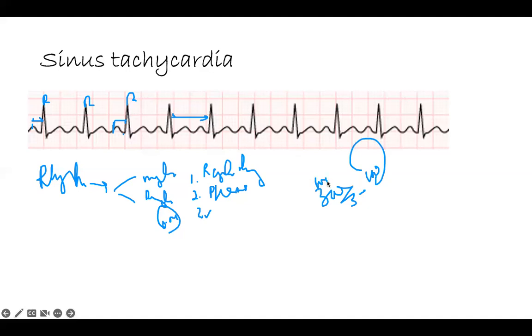300, this is 100. It's not that close, but this is sinus rhythm. It's in the sinus tachy form. So 100 is not that too high, but we'll take it for example. This is sinus rhythm, but the rate is very high, so it becomes sinus tachycardia. Usually they're very close. It has to be greater than 100. This is most close to 100, but we'll take it. Okay.